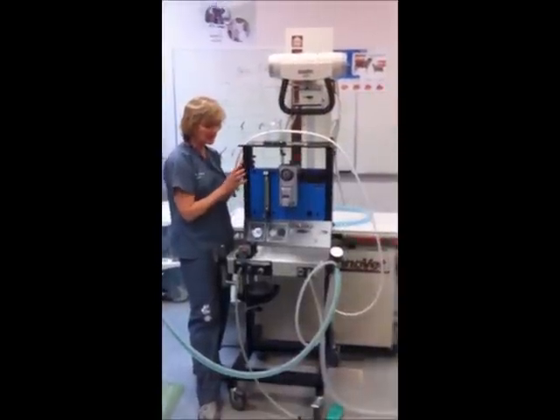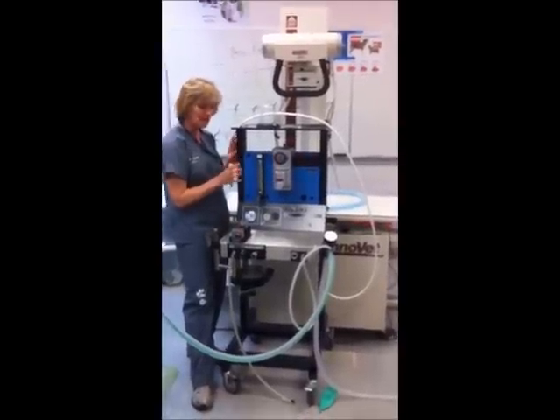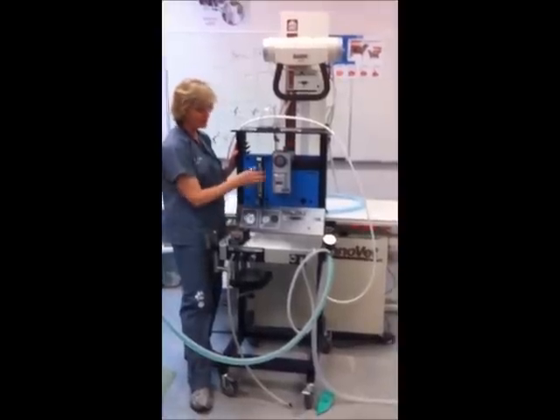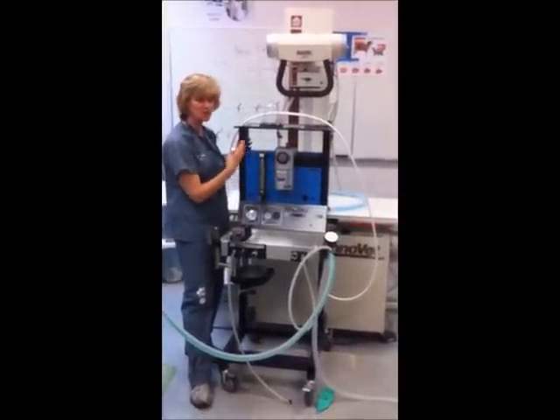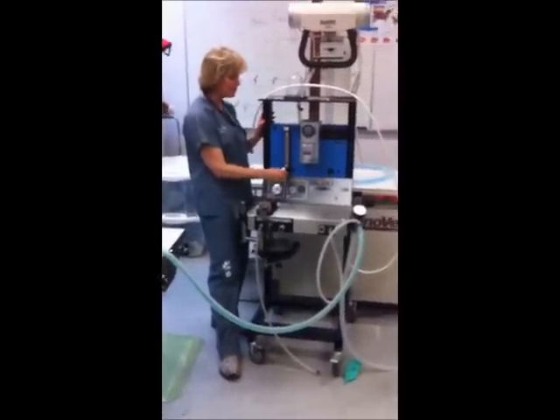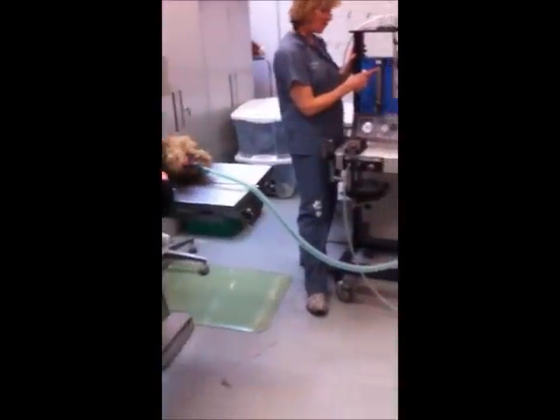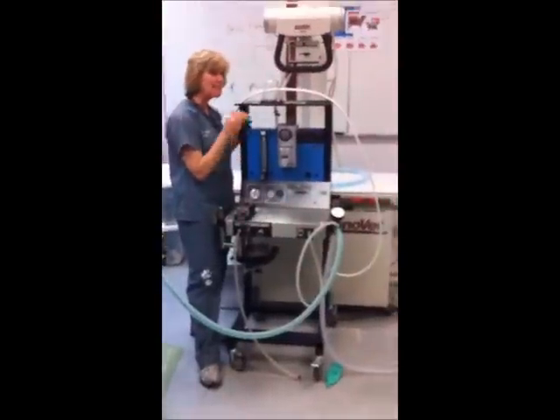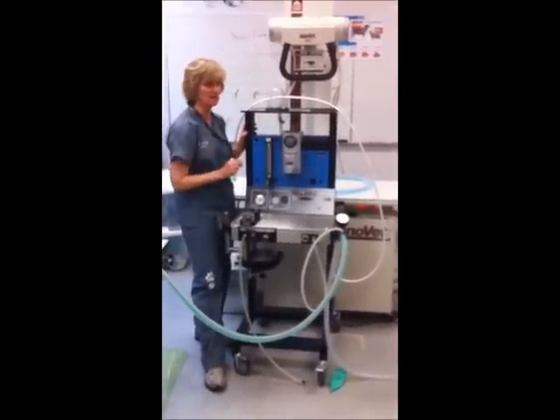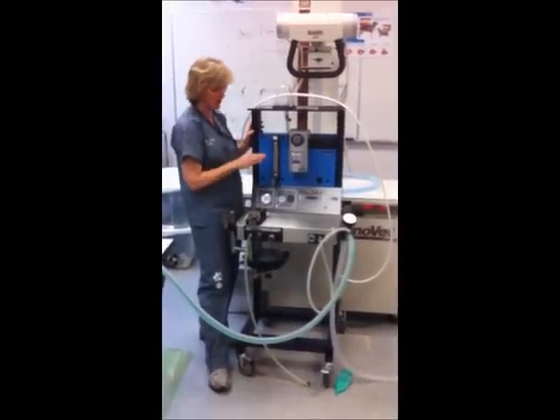But my objective in teaching the anesthetic machine is knowing how to set it up properly and understanding how things flow through. These actually become quite easy when you get out there, but they're just based on the weight of the animal or the size of the animal. So your oxygen flow meter, I won't be saying you've got to set that. But what you do need to know is that the measurement of your oxygen flow on here is in liters per minute. And I can promise you there will be something on the test about that. So make sure you're clear on that.